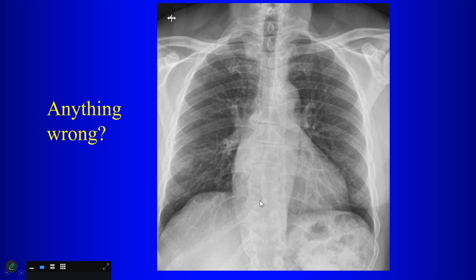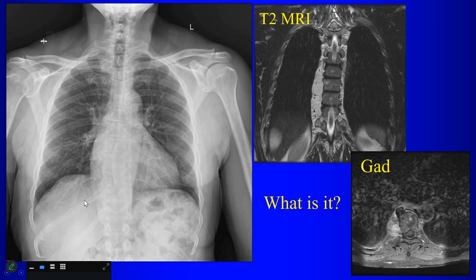Well, the abnormal line is out here, right? Yeah, you mentioned it. This is the azygoesophageal line. What did you say it was? Right paraspinal. That's the right paraspinal line. There's bulging in the right paraspinal line here, going all the way down, right? So what compartment? Posterior. T2 weighted MRI, gadolinium. What is it?